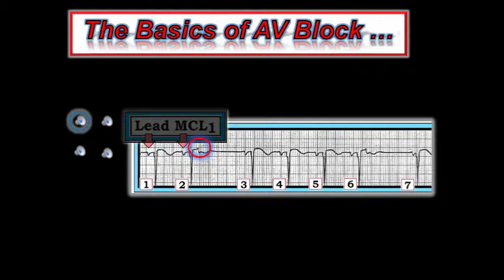Compare what you see within the red circle with the very smooth ST segment of the preceding beat within the blue circle. See the notch within the ST segment of beat number 2, white arrow. This is a blocked PAC. This premature atrial contraction occurs so early within the ST segment that the ventricles are refractory, and this PAC is not conducted.